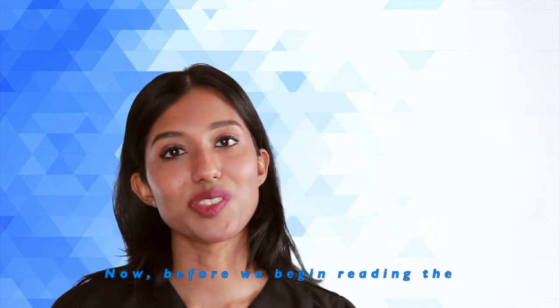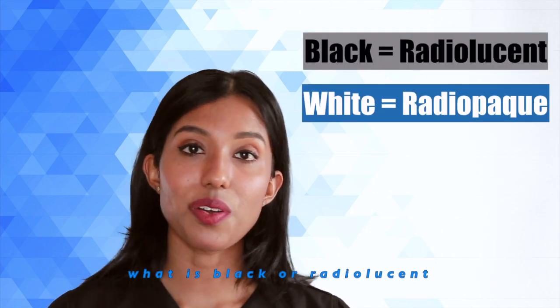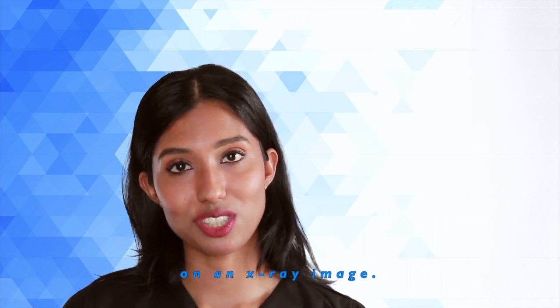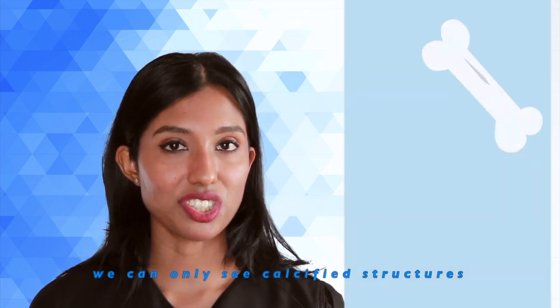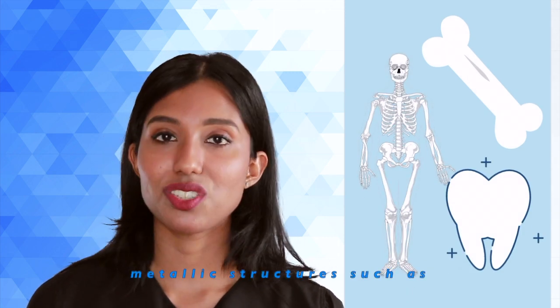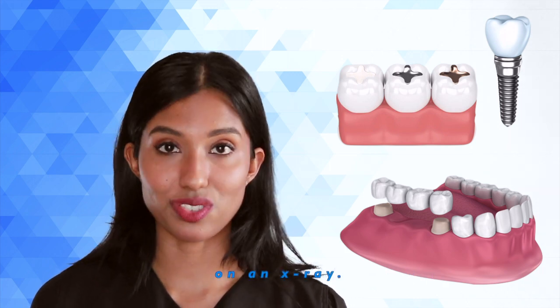Now, before we begin reading the x-ray images, it's important to understand what is black or radiolucent and what is white or radioopaque on an x-ray image. We can only see calcified structures such as bone, enamel, dentin, or metallic structures such as fillings, caps, bridges, implants on an x-ray.